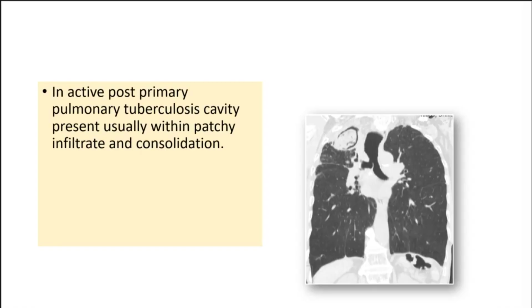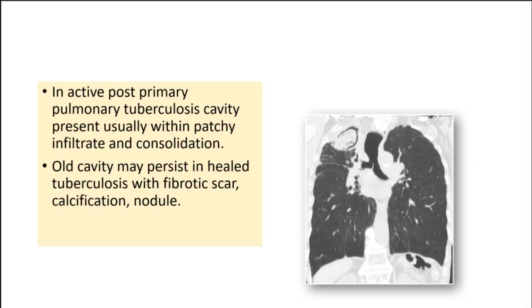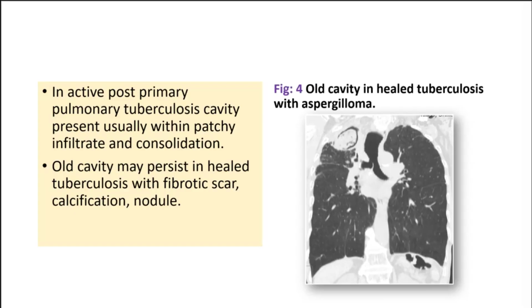In active post-primary pulmonary tuberculosis, cavity present usually within patchy infiltrate and consolidation. Old cavity may persist in healed tuberculosis with fibrotic scar, calcification, nodule. Fig. 4. Old cavity in healed tuberculosis with aspergilloma.